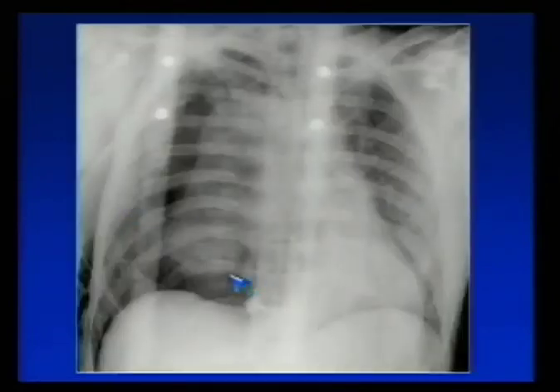How about this? Pneumothorax here, the trauma board. So pneumothorax, leftward mediastinal deviation. What could this be? Tension pneumothorax is what you should consider. You can't make the diagnosis. That requires a clinical diagnosis of circulatory compromise, but that's something that you need to raise the possibility. So you need to raise the possibility this could be tension pneumothorax.